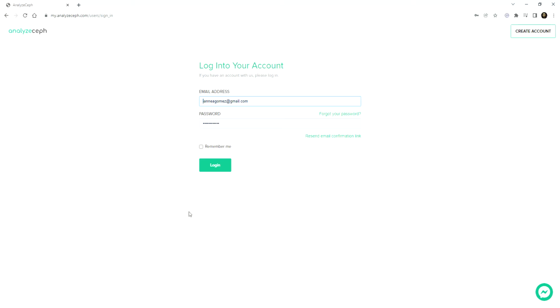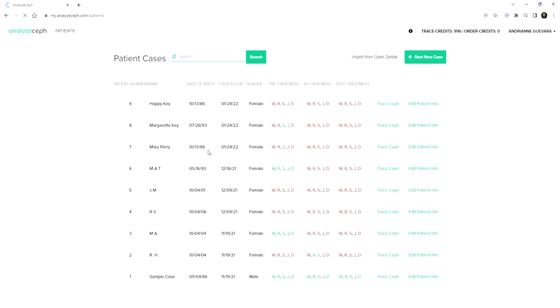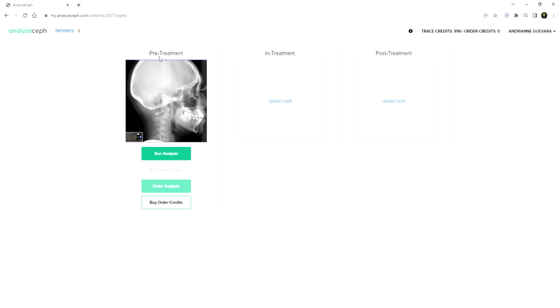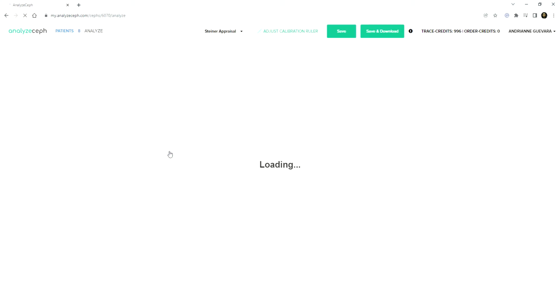Hi, today I'm going to show you how to do the Downs analysis on AnalyzeCeph. First off, you need to log in and choose the patient that you want to run the analysis, or you can start a new case. So in our case, I already uploaded it here, and I'm choosing patient number 8. So let's choose Trace Ceph, and we're doing the pre-treatment. So let's run the analysis.